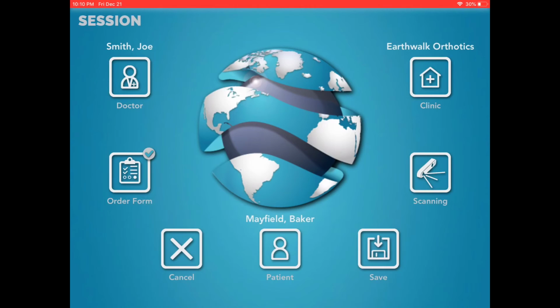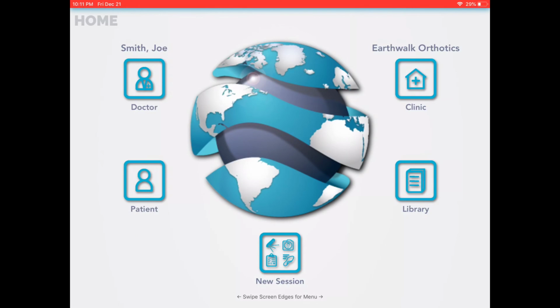Now we filled out the order form. You see that has a check mark. If we did the scanning, it would have the same thing next to it. But as I said, we're going to dive a little bit deeper into the scanning later. So we hit the save button, and then we go to our library view.